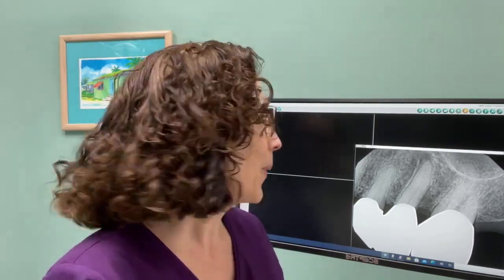And when you see on an x-ray a dark shadowy area right there, you know that that's an abscess, an infection. So it could afford us in dentistry the ability to be able to say to a patient, I can see that, and that's an abscess. And so if you want to take care of that, we need to have a root canal in order to get rid of that infection. And we can do that before it causes you a lot of discomfort or swelling in that area. So an x-ray allows us to see that because that's up in the bone.